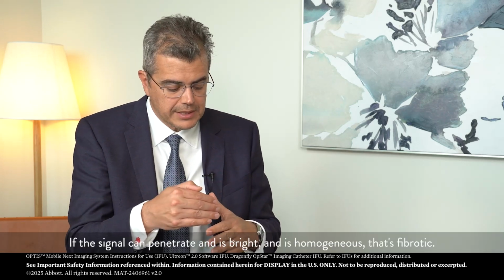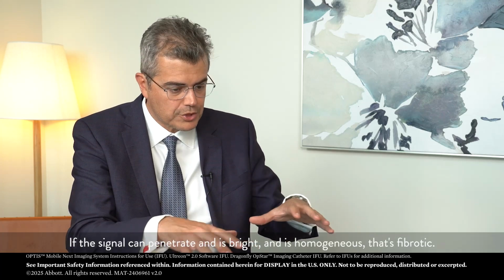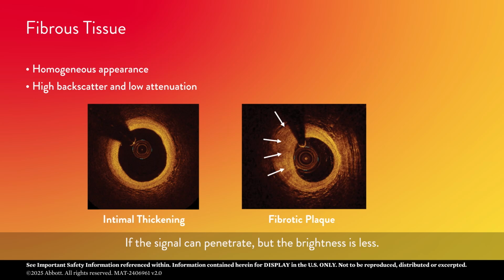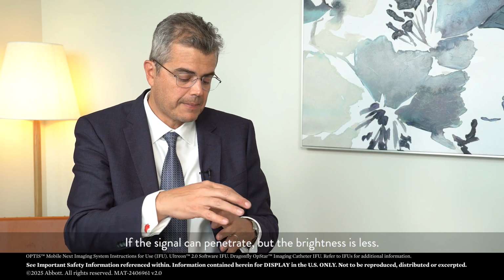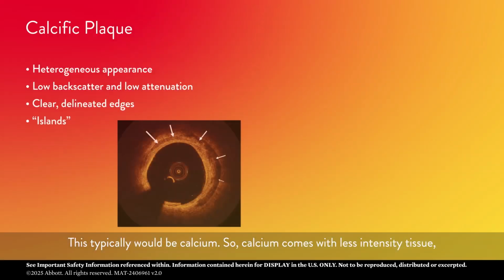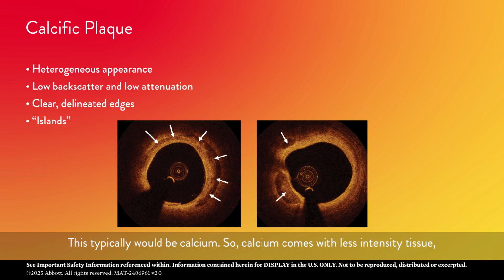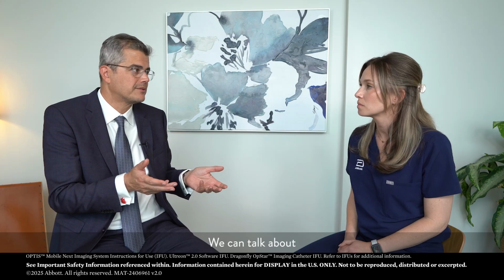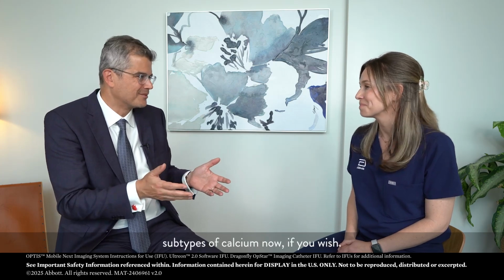If the signal can penetrate and is bright and is homogeneous, that's fibrotic. If the signal can penetrate but the brightness is less, this typically would be calcium. So calcium comes with less intensity tissue, high penetration because you don't lose energy penetrating calcium, and very well defined borders, the typical calcium, right? We can talk about subtypes of calcium now, if you wish.